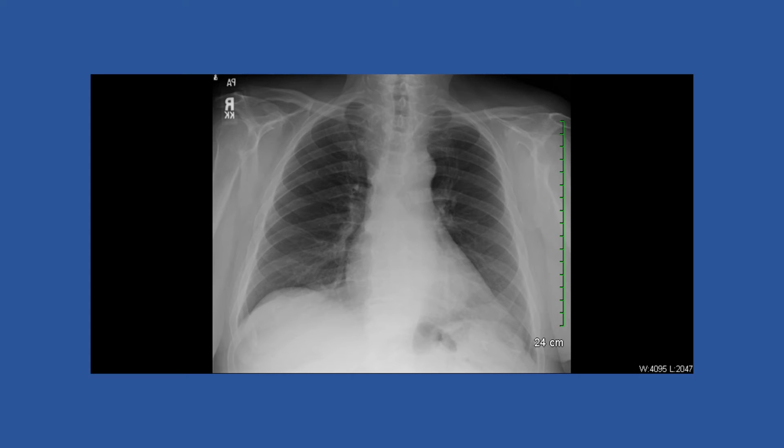So if we look at this patient, we see that the gutters are clear. If we run the margin of the heart, we're not seeing any blurring of that margin, so there's no evidence of infiltrates or problems. If we run the entire border of the x-ray, we see that there are markings in there. It's not just plain black. There's no line of black and then a little bit of gray with the markings, which is what you would see with a pneumothorax. So this is actually an all clear chest x-ray, no sign of pneumothorax.